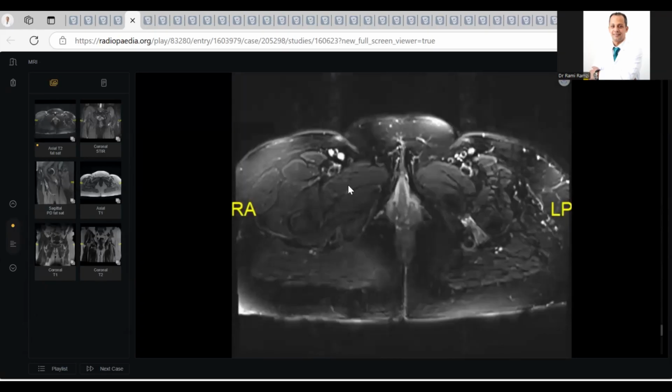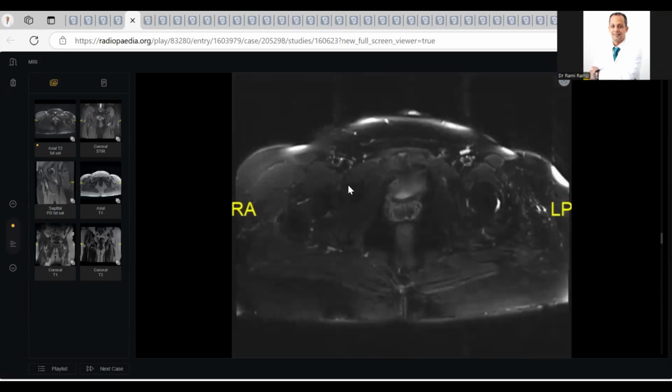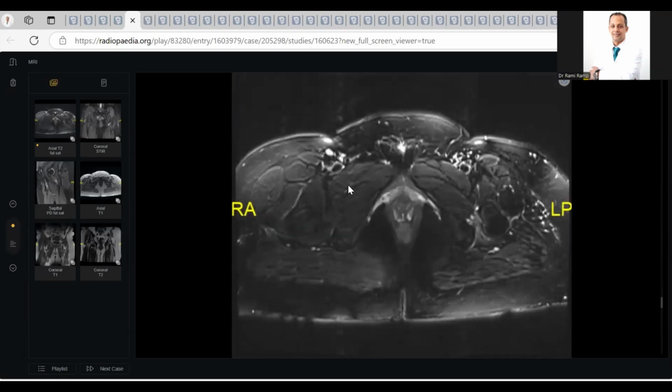In this case, you struggled and you just told me there is edema here. See, my colleagues, compare this. This is ischiofemoral impingement syndrome. What happened here? The quadratus femoris muscle belly is severely compressed between the lesser trochanter and the ischium here. So it is markedly edematous.